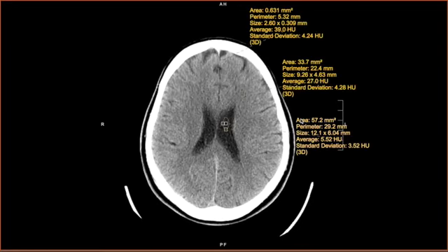We've marked some of the major densities that we've discussed already. This here is CSF. It's the ventricles filled with CSF. The average density here comes out to be about 5 Hounsfield units. We said it's about water.